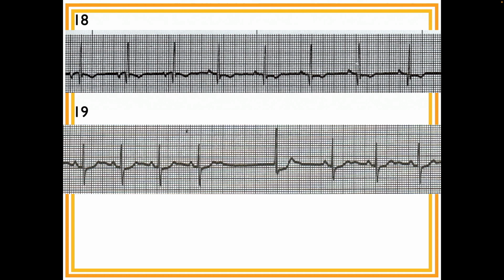Well, I'm okay with the sinus pause, but what's this? It's a great question. It's an oddball beat, and most of our oddball beats are premature beats. But there's that other class of beats that actually comes in late. Who remembers what they're called? Escape beats. So it's an escape beat because it comes in late.